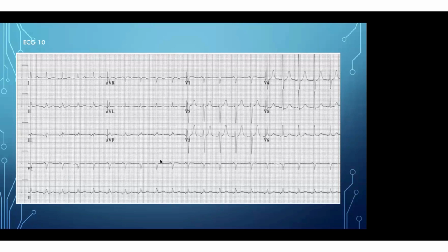The focus of the atrial tachycardia is coming from the inferior, maybe from the low atria, coronary sinus, or somewhere around the tricuspid annulus area. So this is ectopic atrial tachycardia, which is most commonly seen in patients with congenital heart disease, or post-operative patients, or patients with sick sinus syndrome. All this group of patients will have ectopic atrial tachycardia. It's a type of tachycardia which is narrow QRS.